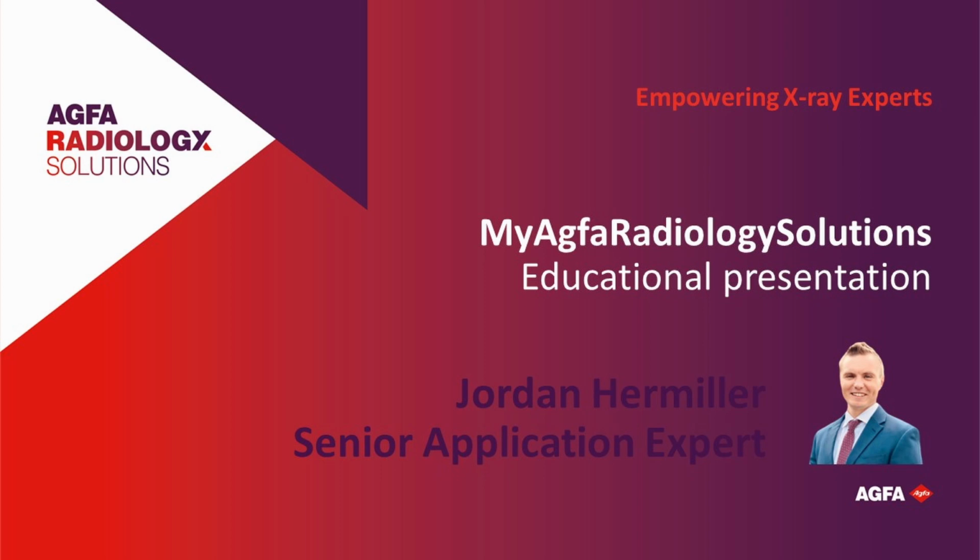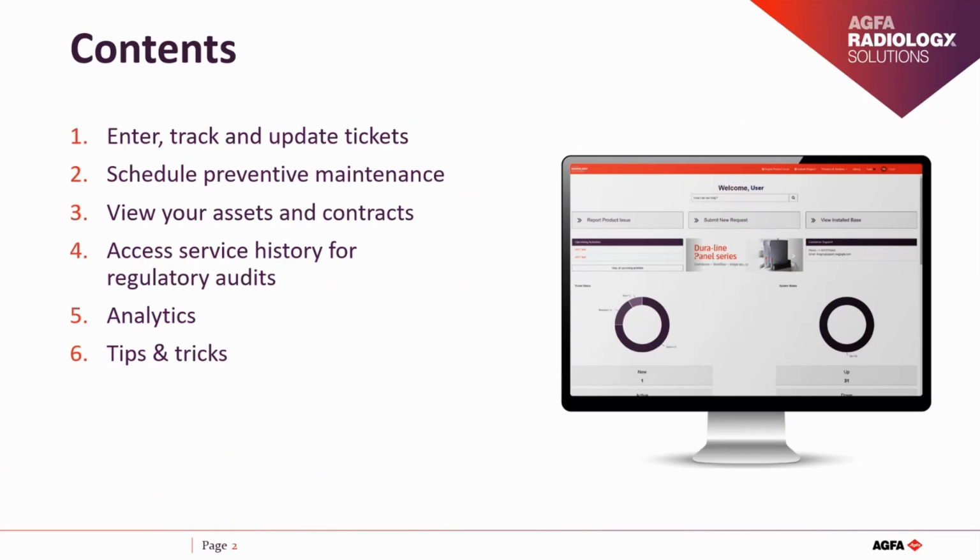Welcome to MyAgfaRadiologySolutions, a web-based portal allowing you to conveniently manage your Agfa install base. In this short instructional video, we'll cover how to enter, track, and update tickets, schedule preventive maintenance, view your assets and contracts, access service history for regulatory audits, analyze detailed reports on rejects, dose, and asset utilization, and finally, we'll offer some tips and tricks to make navigating the site and managing your equipment even easier.